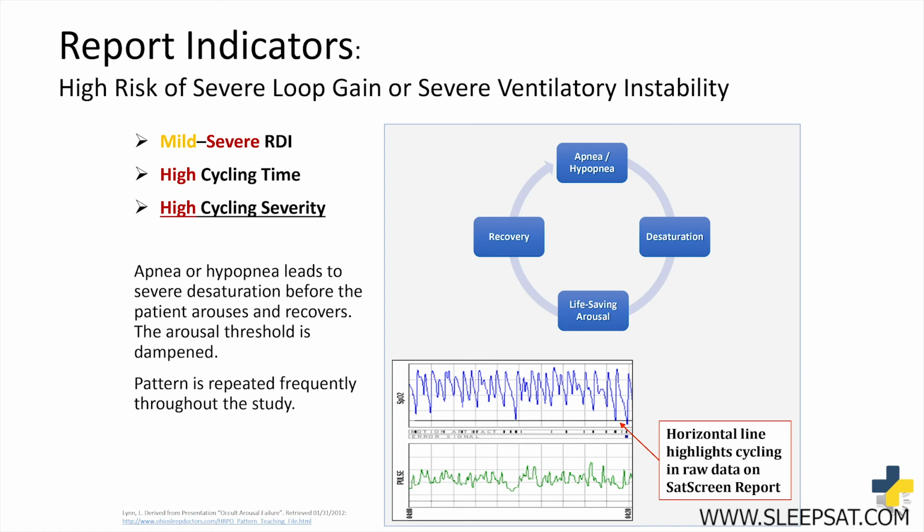Apnea or hypopnea lead to severe desaturation before the patient has a life-saving arousal and recovers. The arousal threshold is dampened and the pattern is repeated frequently throughout the study.